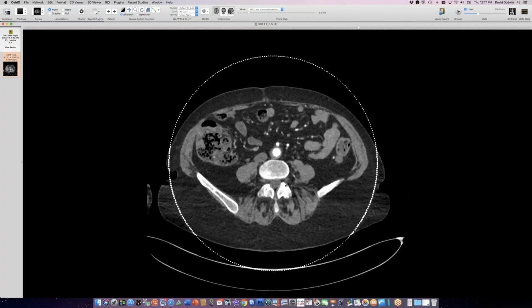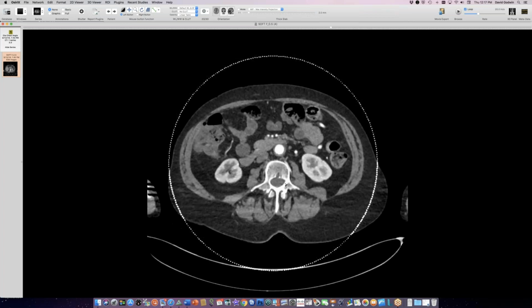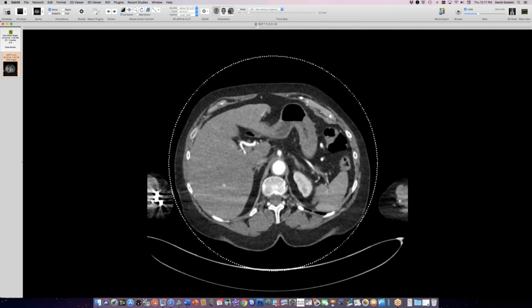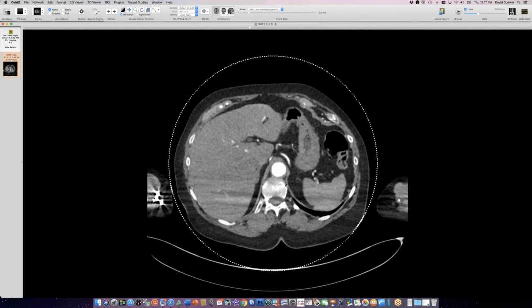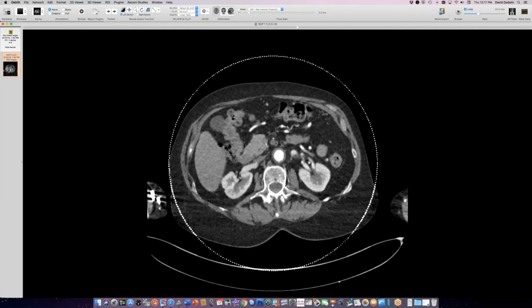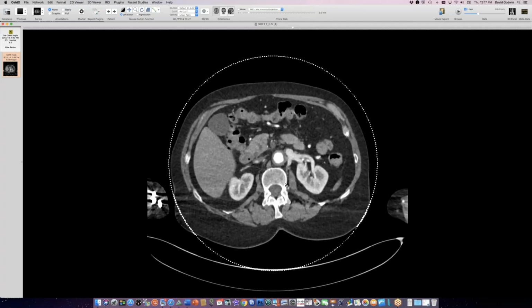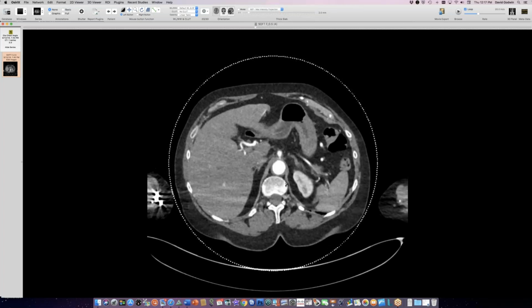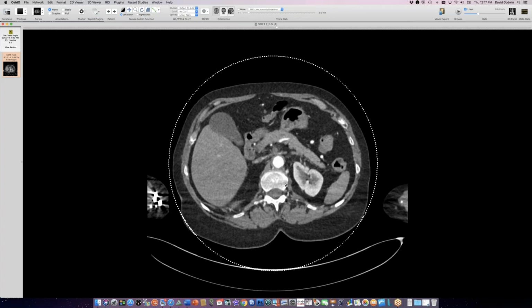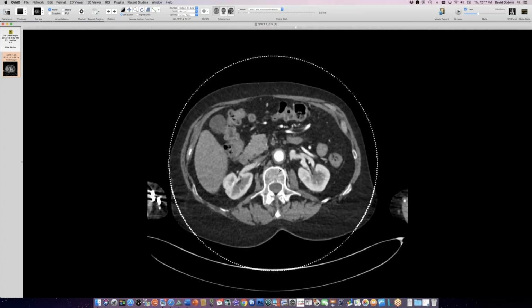And so people were talking about IgG4 disease and a whole bunch of things, and giant cell and stuff like that. So one of the considerations is that this is Erdheim-Chester. Now, there are no halos around the kidneys, which would be pretty good for Erdheim-Chester. We have seen people, before we had a case here, of primarily aortic disease from Erdheim-Chester. So that's definitely on the list.